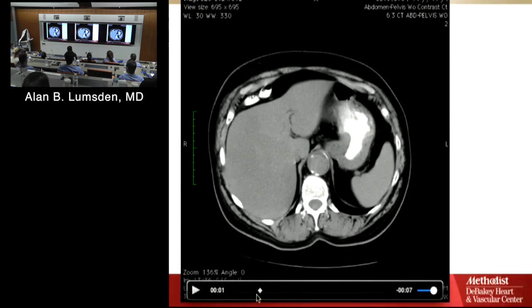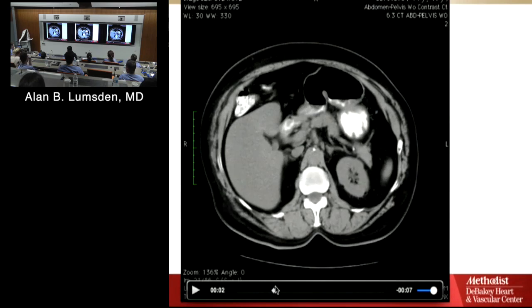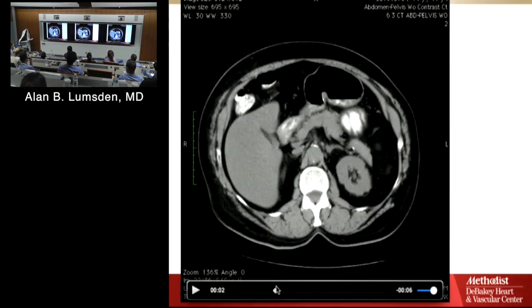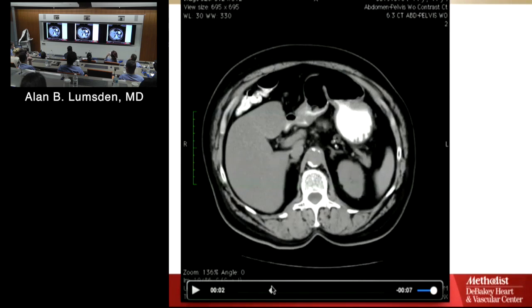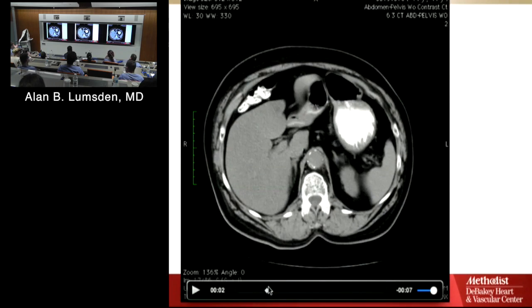Now, come on down. Okay, watch for the celiac. There's the celiac right there. Okay, non-con study, but you can still see it with that calcification at the orifice. So to get to that, you're exposing it right here. You're dividing that diaphragm in order to get control. And if you're going to do supraceliac aortohepatic bypass, aorto SMA bypass, you're going to come off right in the front of this here.